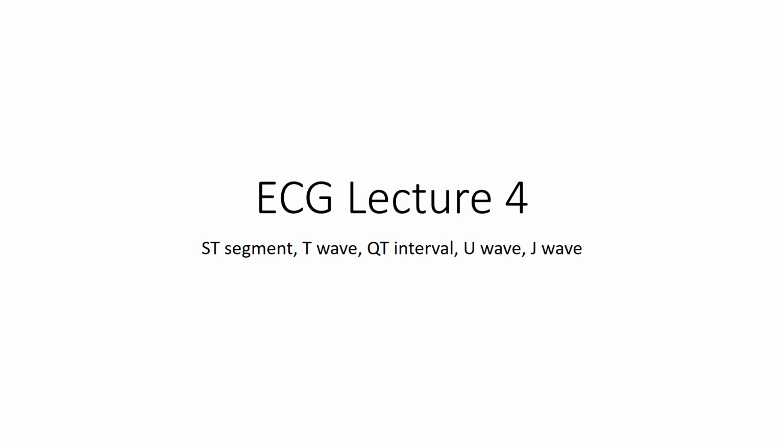In this video, we will discuss the ST segment deviation, abnormalities of the T wave, the QT interval as well as the corrected QT interval, the U waves, J waves, and the effect of various electrolytes on these entities.